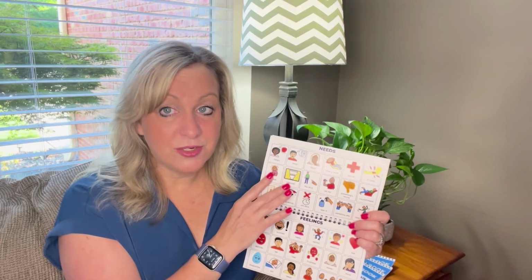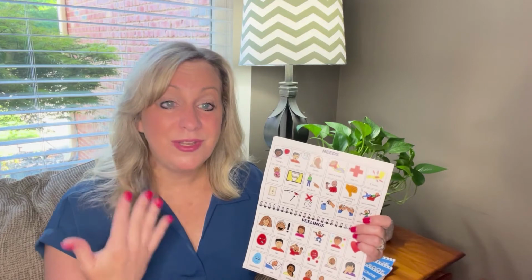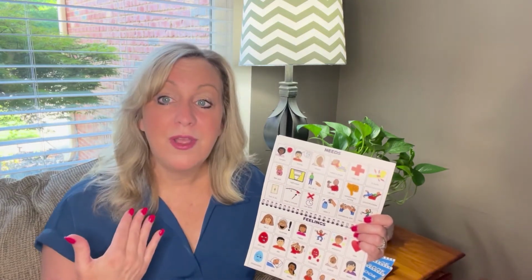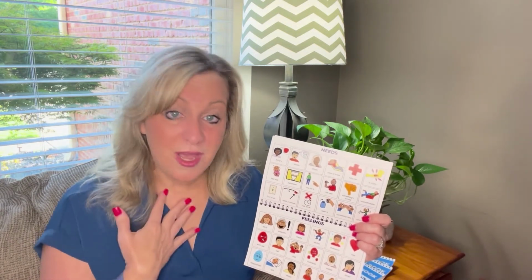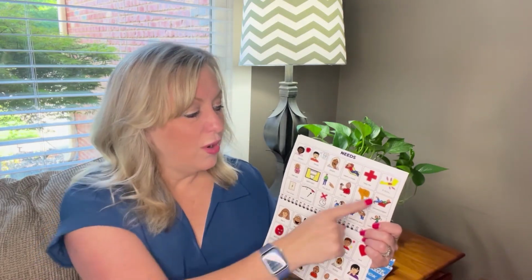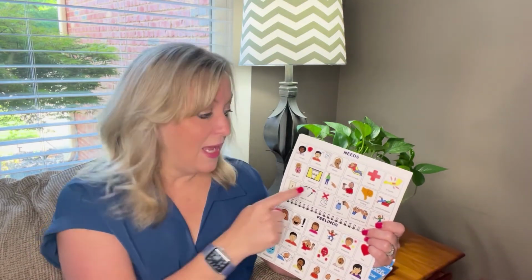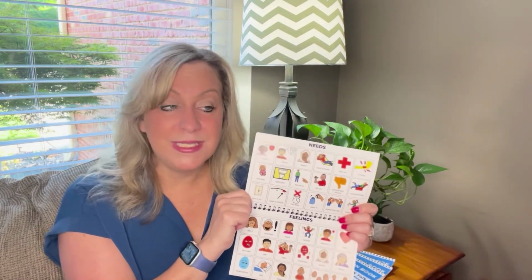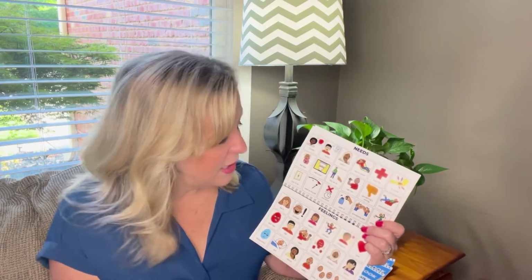When a student is just learning to communicate, if they have to use a communication system that's brand new to them, so pointing at symbols in a situation where they really need something, it's very hard under that level of stress to learn something new. So this is going to allow them to watch us say things like, oh, I need a break, and stopping for a minute. Or, oh, it hurts. I bumped my elbow. Maybe I can say things like, excuse me, I need to go to the bathroom. So we're going to give a model for these basic human needs outside of a situation where the student is under stress and needs to communicate it themselves.